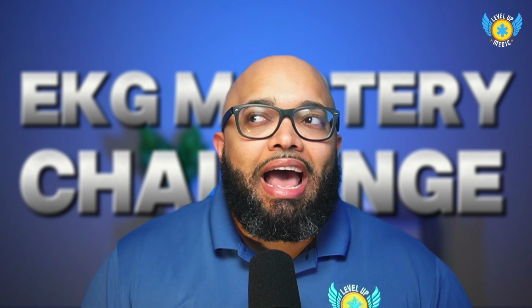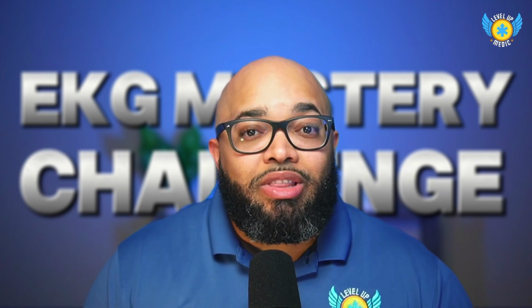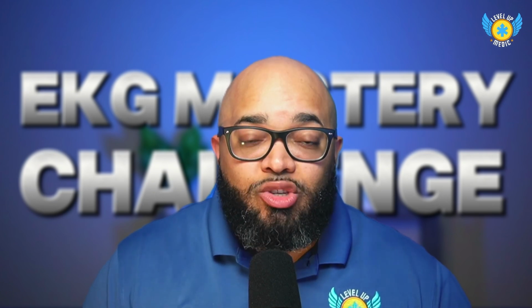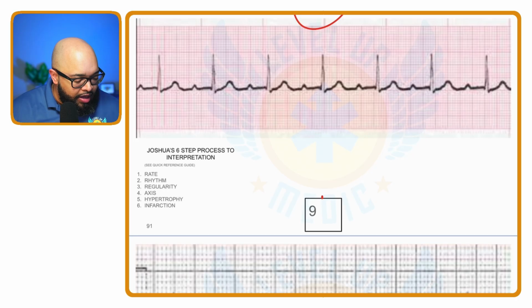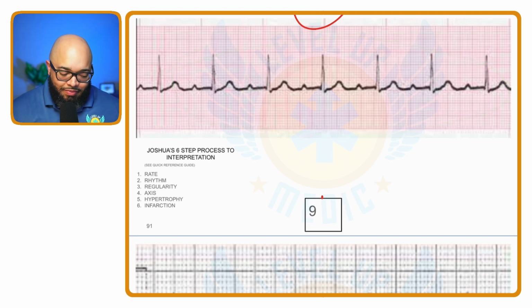How much time should the PR interval be? It should be within 0.20 seconds. That's one big box worth of time. Well, here, notice here is one big box, but this PR interval is this much space. That's greater than one big box, right? So what does that tell us? Everything about it looked like a sinus rhythm, except the PR interval is prolonged.